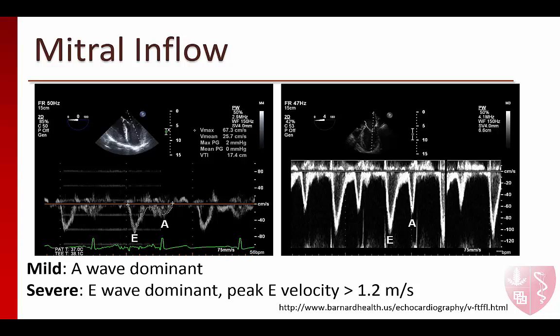This is a fast, reliable way to exclude severe MR, but is subject to several limitations. Specifically, it is not valid in atrial fibrillation, as the A wave will be absent, and is heavily influenced by the left atrial pressure and the presence of diastolic dysfunction.